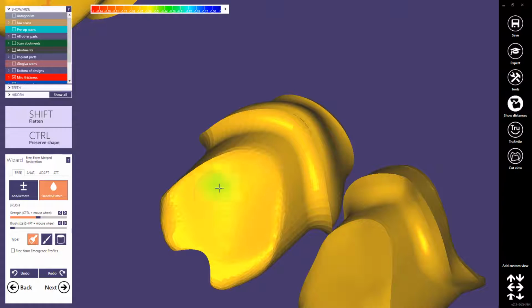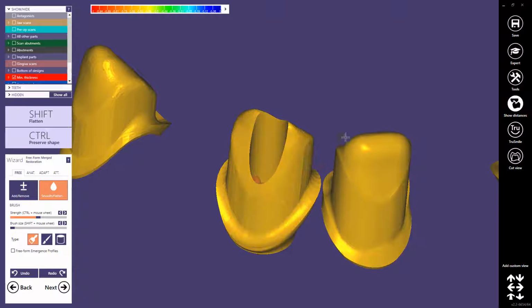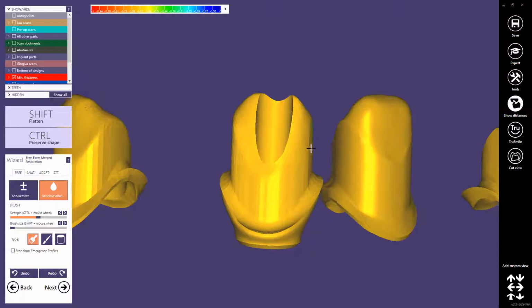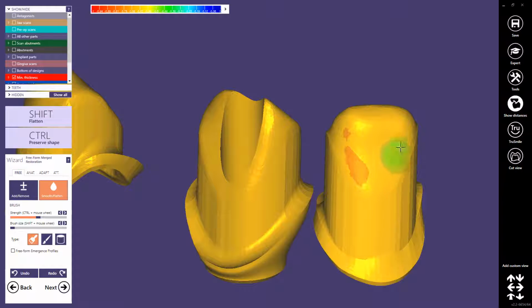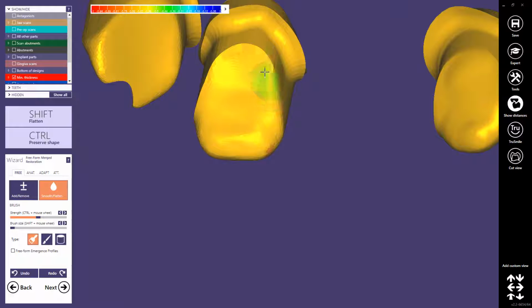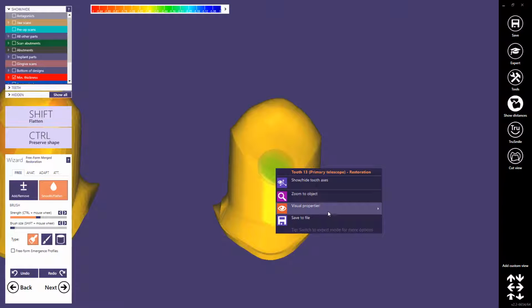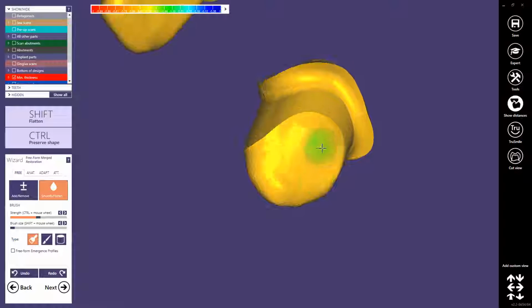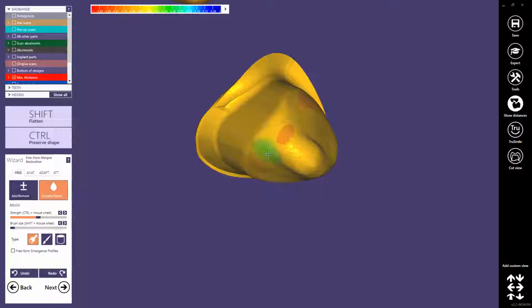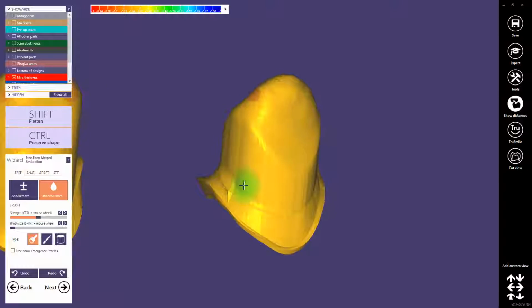I avoid these edges because you might have problems if you mill the second parts, because on this shape there is no tool compensation, and you have a much easier insertion later. Don't worry about the minimum thickness, it will be recomputed automatically. Okay, now let's finalize these transition areas.